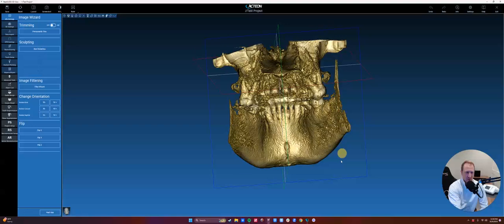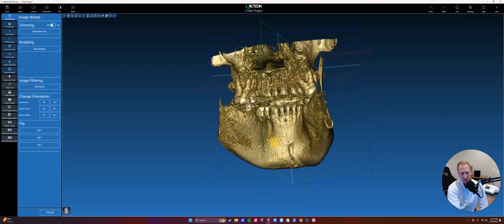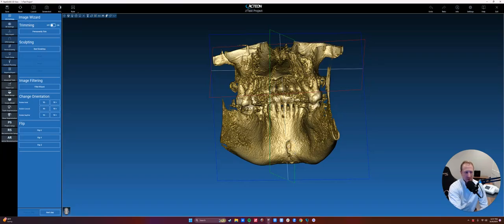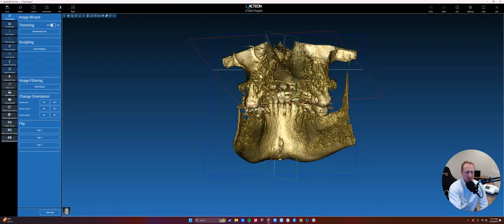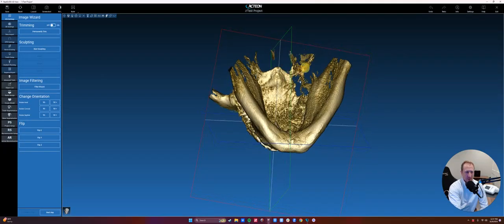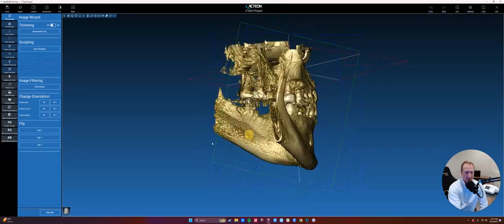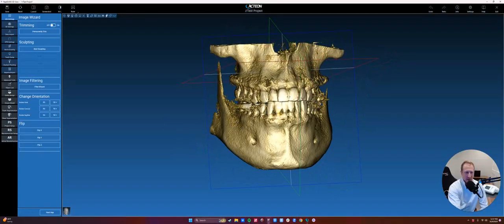Here we can spin the patient around, get an idea of where the genioglossus attaches, right, and where the sublingual artery anastomoses. And if we flip them up, we get an idea of here's the greater palatine foramen if we're doing like a V2 block or a GP block, right? So nice to be able to see the gross anatomy.